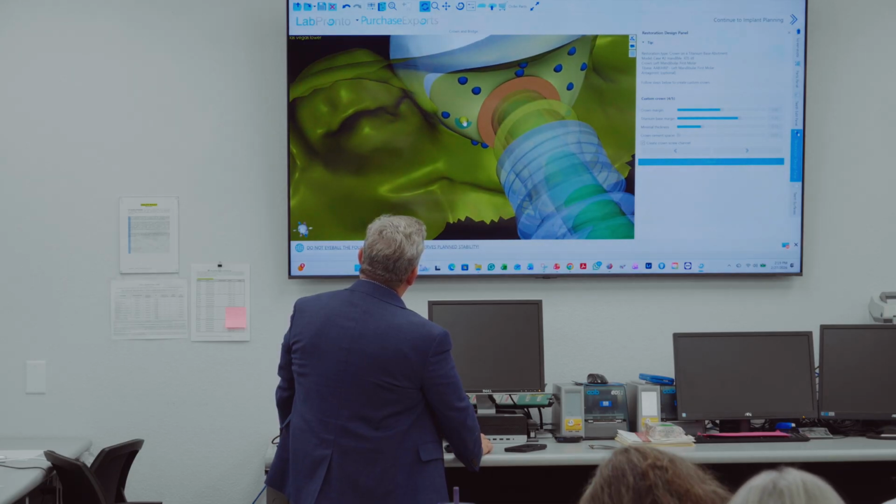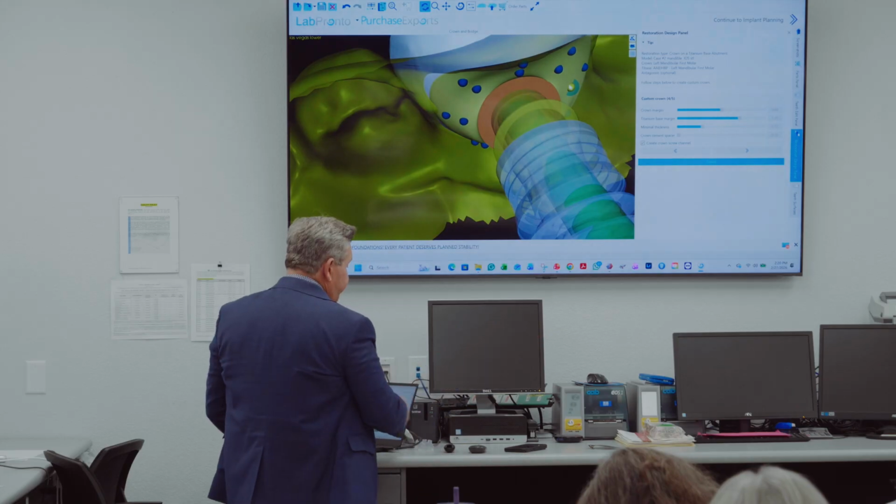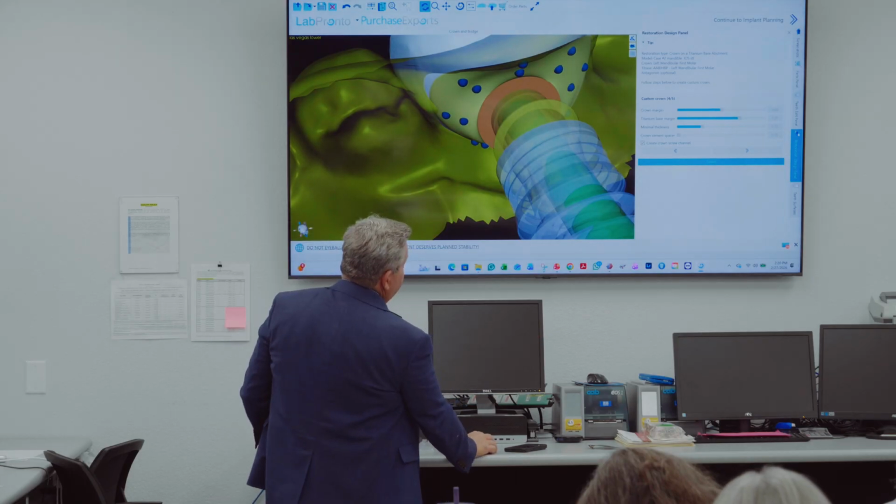There we go. Okay, you can click on these and you can morph out, bring out some of these contours, kind of swallow them out a little bit. I'm left clicking on those. I'm just kind of playing with it to show you. So if you had a defect in the tissue, you could fill that in. But you can even do more. So click next.